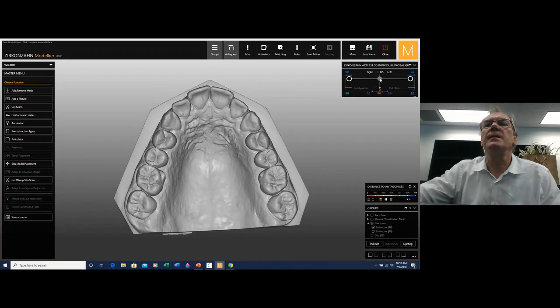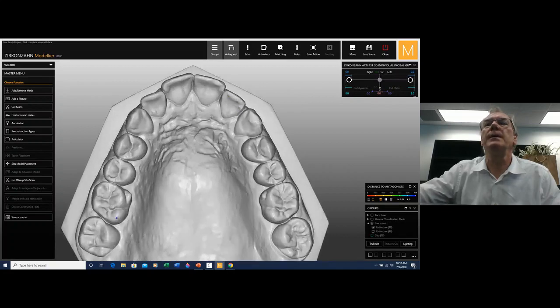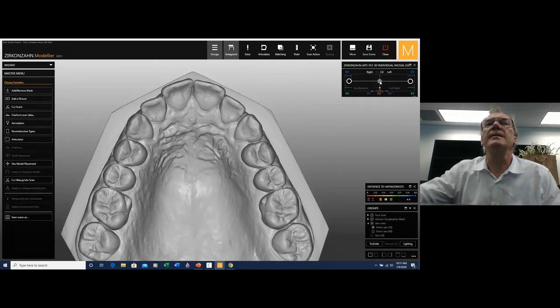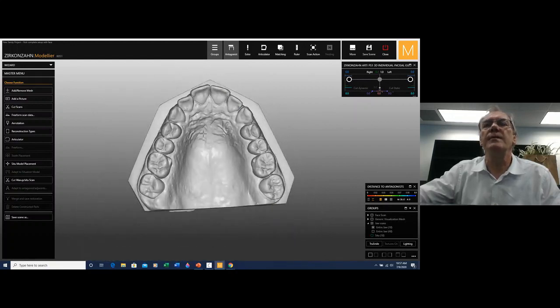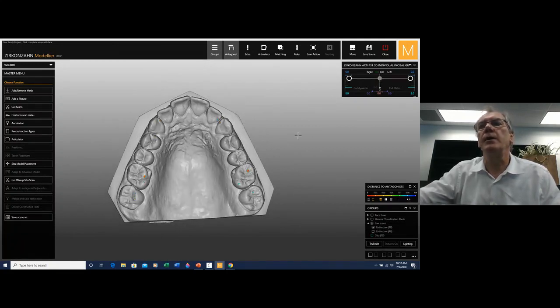They persist in the second phase, and then the lateral takes the movement and is taking it all the way up. So there's a lot of weight, a lot of load on that tooth until the central incisor takes the load. So these two teeth really do need to be evaluated. We are going to evaluate moving them around with an ortho procedure, but at the moment, let's just focus on the lateral movements.